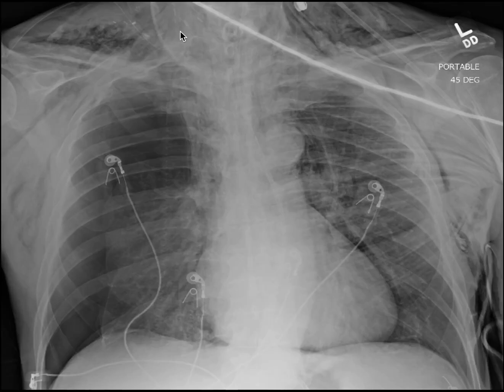Now, you can't quite see the tracheostomy tube here because of the angle that this film is shot. The patient's also significantly rotated here, and there are overlying structures. But one thing that we know, just by looking at this film, there are bilateral pneumothoraces, and there was a recent tracheostomy that was placed that apparently earlier in the day was exchanged. You must conclude that the culprit is the tracheostomy.